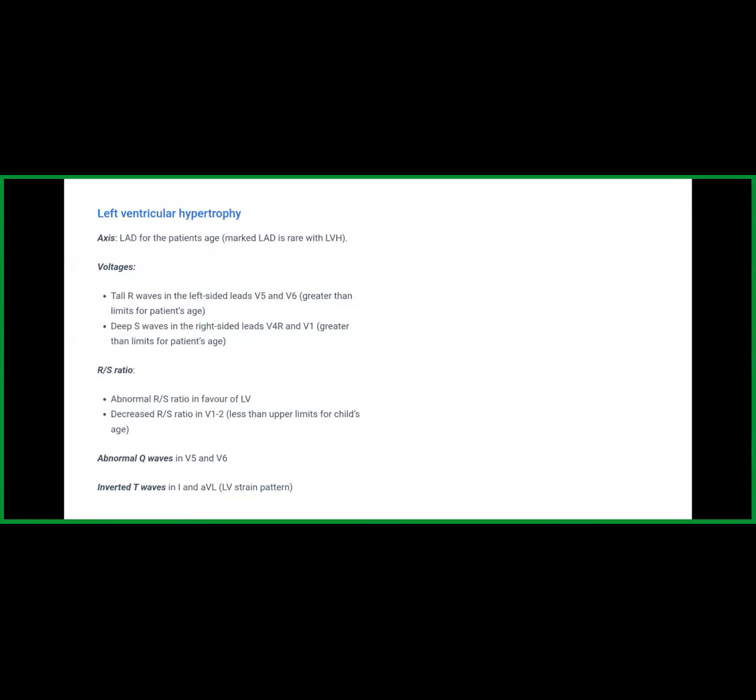We are going to discuss this with ECGs in subsequent lectures. One rule which I want you all to remember is the Evans rule. The Evans rule says that abnormal left ventricular large voltage, LVH, will be seen in V6. So if the R wave in V6 intersects with the baseline of V5, it is abnormal. Any waveform where you see that the positive deflection in V6 is so positive that it is crossing the V5 waveform means left ventricular high voltage, left ventricular hypertrophy is there.